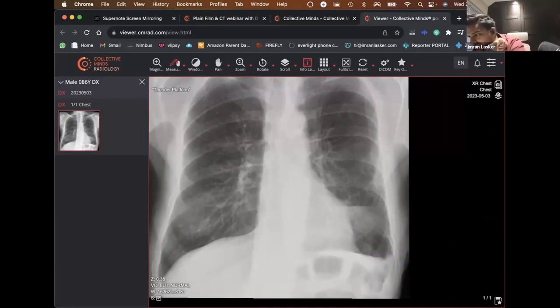Someone said that there is what looks like a linear density that's going along like this. So straight lines like that should not exist. They just should not exist in the human body. Not when they're so linear. Either someone's put something in, or what you're looking at is essentially what you're saying: it is a fluid level, right? Because the patient's standing up when they're doing this X-ray, you've got a fluid level like this. So people are saying all the right things.